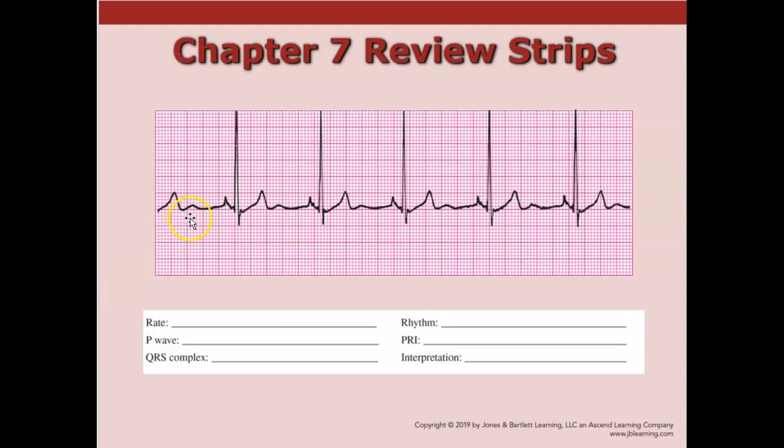Now, when we look at this right away, usually what I find myself doing is, when you first glance at something, there are certain things that might stand out. Like this looks to be pretty regular when you glance at it, but when they're irregular, it'll stand out. But you look at these P waves, they look a little off. But that's not what we're concerned about right now, right? So a lot of times we'll see some things that don't look quite right just when you take a glance at it. So let's take a look at our rate.